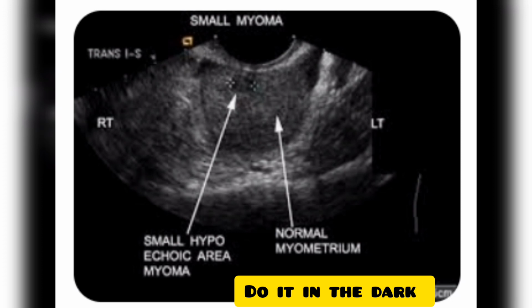If we do the histological examination of the uterus which has been hysterectomized, only that will give us the confirmatory report. So the prevailing muscles there, because of them we have the specific appearance. These solid masses absorb sound waves and therefore cause a variable amount of acoustic shadowing. So you can see the specific appearance in this ultrasound image. You can see concentric solid as well as hypoechoic masses.